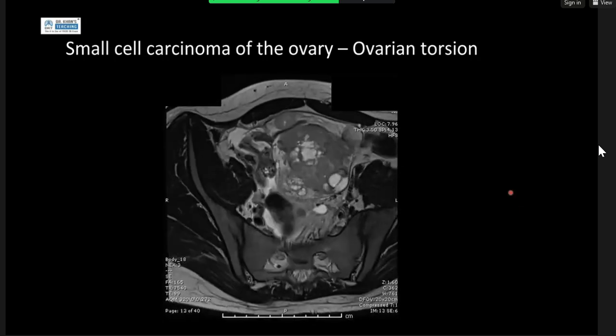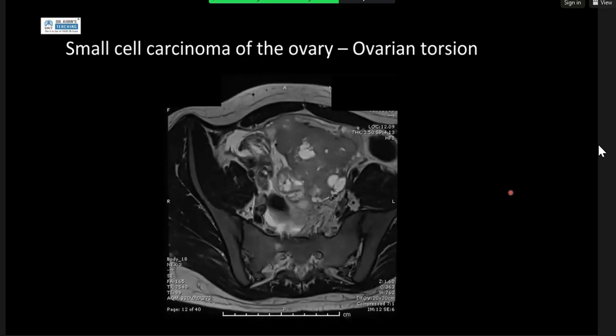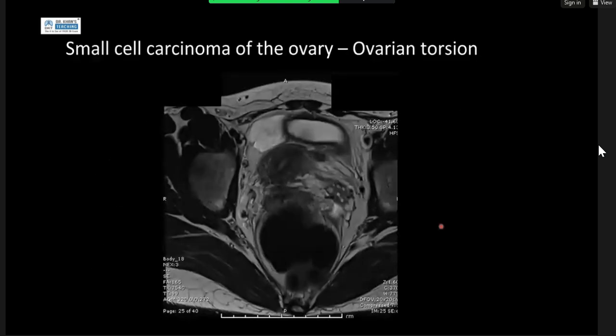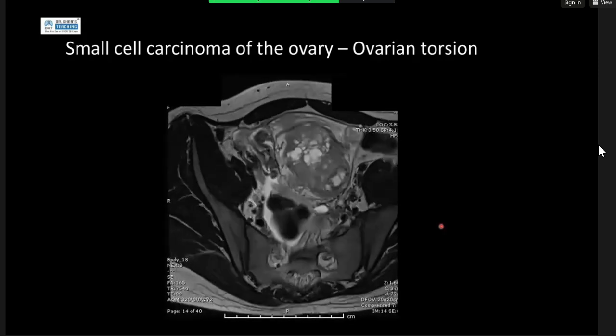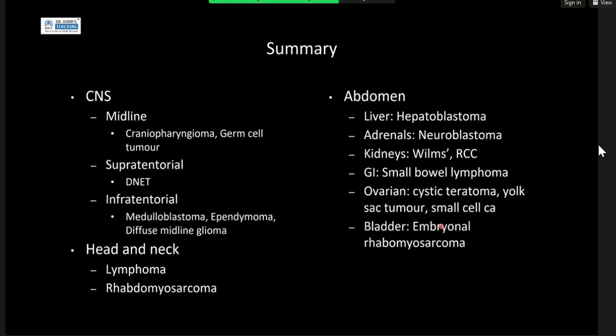You can't often see the twisting, but with the evidence of a congested vascular pedicle, the ovarian vascular pedicle, as I'm going down now, and in combination with the fact that you've got this uterus that's pulled to one side, the side of the congested pedicle, on cross-sectional imaging, these are signs of ovarian torsion. We often mention it on ultrasound, but we don't really look for it on cross-sectional imaging. I thought this case nicely shows that. Okay, so congested pedicle, uterus pulled to the side, think of ovarian torsion.